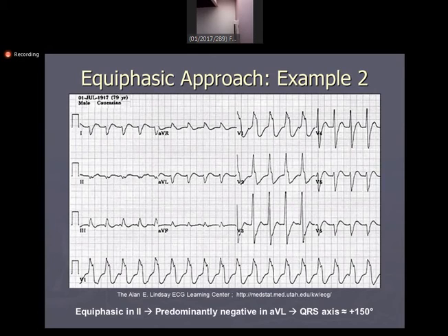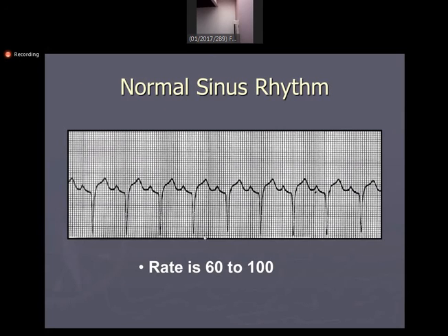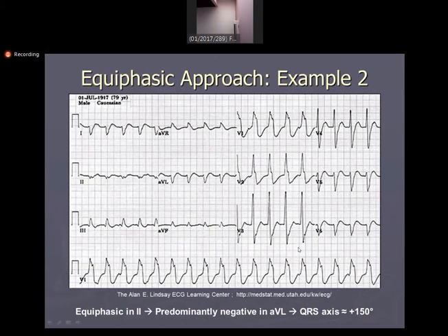So now you can see, up till now, what is sinus rhythm? If electrical activity generated from the SA node forms a P wave, it is called the sinus rhythm. And to calculate the heart rate, as I have already explained, you take a 6-second strip, count the beats in these 6 seconds, and multiply by 10, and you will get the heart rate in 1 minute.